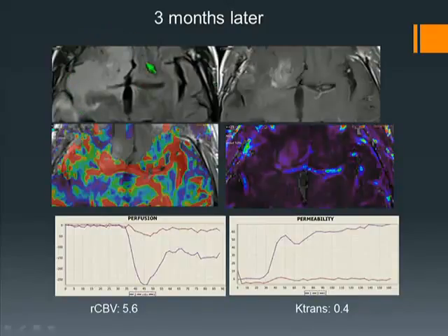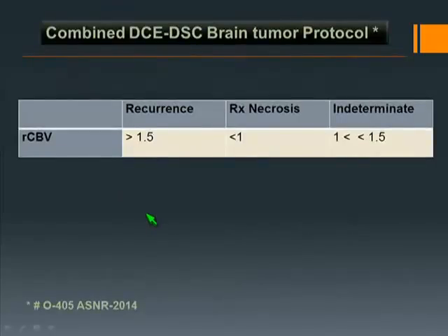You can clearly see extensive infiltrative glioma. Now you have enough tumor away from the planum sphenoidale that you can also pick up the increased RCBV, and this was a pathology-proven glioma. So this is how we interpret our perfusion imaging for brain tumors. And again, that's what we adopted in our practice. It could be significantly different from what a lot of people use in this room.